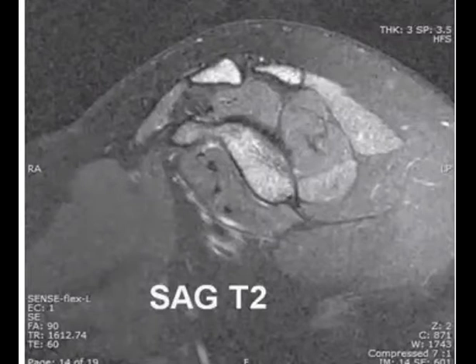Perfect. So this is like a triangle or anatomical region between the long head of triceps and teres minor and teres major muscles, okay? Plus the humerus. Start with edema, as you see here, and eventually it will go to atrophy.